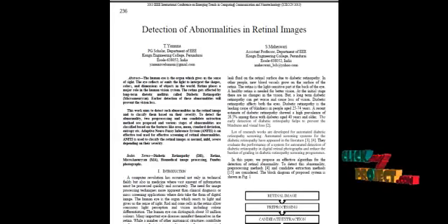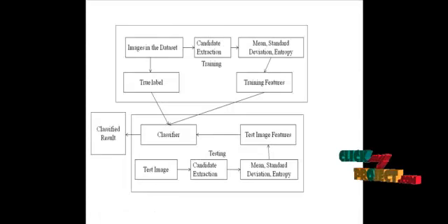Since ANFIS is a supervised classifier, we have to give the true label for the classification process. So the true label, train image features and the test image features were passed into the ANFIS classifier. First, the ANFIS classifier clusters the training features into the categories that we have specified, and then finds to which category the test image feature belongs, and produces the result. Finally, we are measuring the performance of the ANFIS classifier by calculating the accuracy, sensitivity, and specificity.